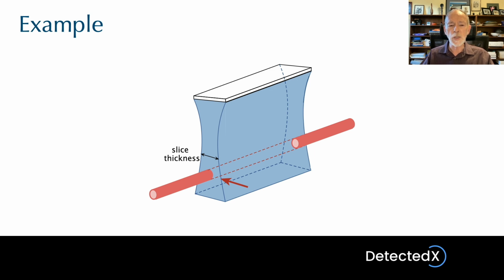So the tissues beside the blood vessel will be contributing echoes to the image, and those echoes will look in the image as if they have come from inside the blood vessel. So we will see soft tissue echoes appearing to be inside the blood vessel. And of course, this mimics the appearance of thrombus. So it's a very significant concern. Let me show you an example.